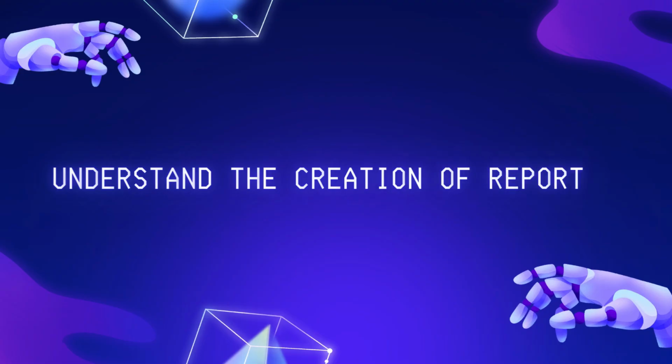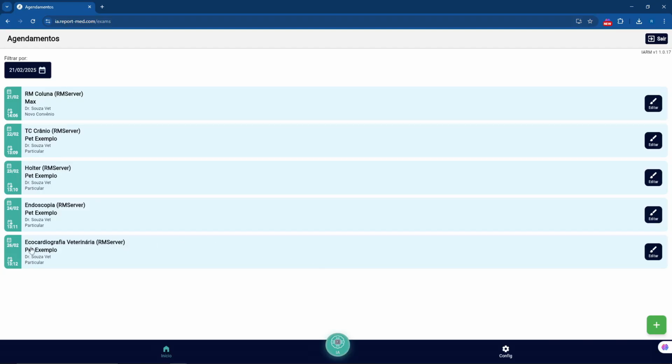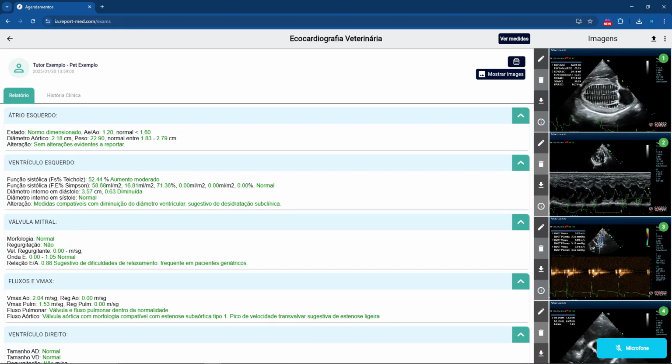Understand the creation of reports. Simply click to start creating the report. Hello, Dr. Souza. I have analyzed the exam for pet example and found some abnormalities. I have already updated the report based on these findings.